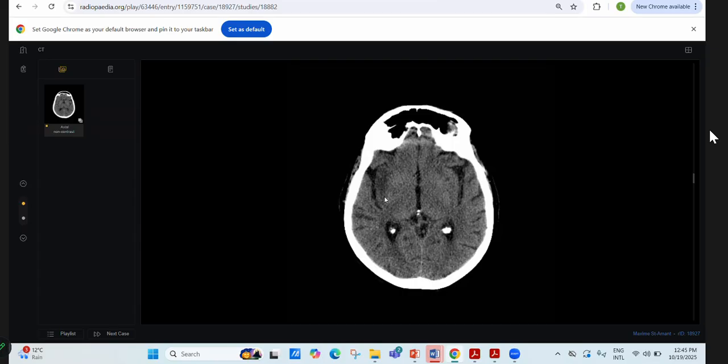And then you explained beautifully that there is no involvement of the basal ganglia. I thought you were there, but you were still not there. Because this is the differentiating point between herpes encephalitis and infarct. It is limited to this area, not involving the basal ganglia. Then I gave you history to direct you more: fever and a short history of confusion. And still you were on the SOL.